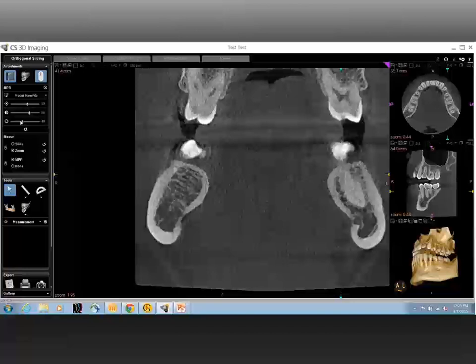online presentations. So in summary of what you were saying, to go back to it, number one was integrity of the cortical bone. Number two was structure of the cancellous bone. And number three was the trabeculation pattern. What other anatomical structures, if any, do you focus in on?